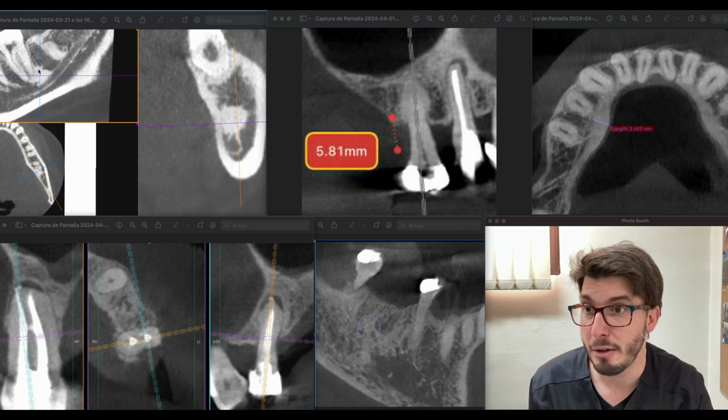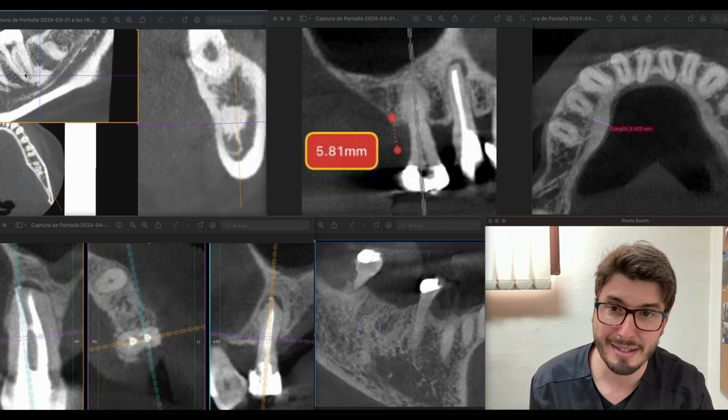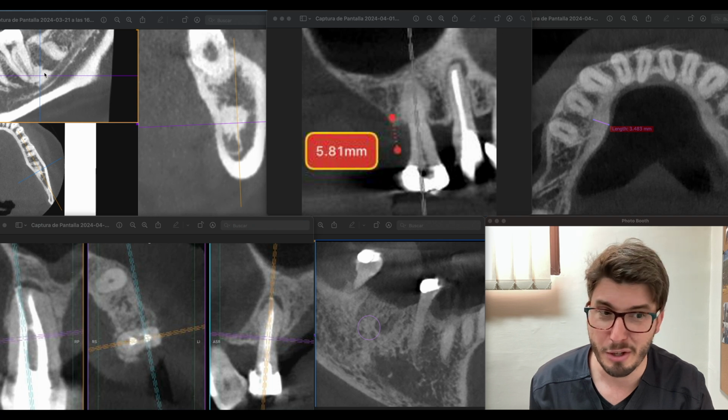And it's periapical because it's also in continuation with this apex here. So if you guys are thinking about condensing osteitis, well, it's not so radiopaque, usually it's not so condensed like this, so it's not the first option, and we have another case to discuss about condensing osteitis.